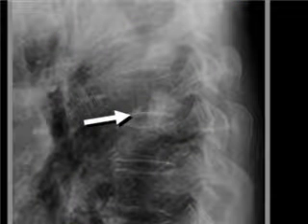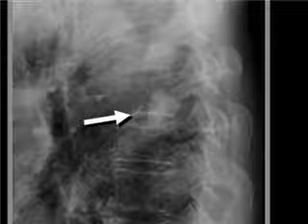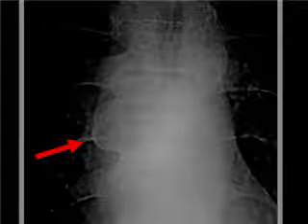When you see a density overlying the spine, which more or less is superimposed on the intervertebral disc space, as this is, then you have to think about the possibility that the so-called nodule is actually a large osteophyte. And if you look carefully on the frontal view of this patient, you can see that the red arrow is pointing to a very large osteophyte at this level, which can be easily mistaken for a lung nodule.